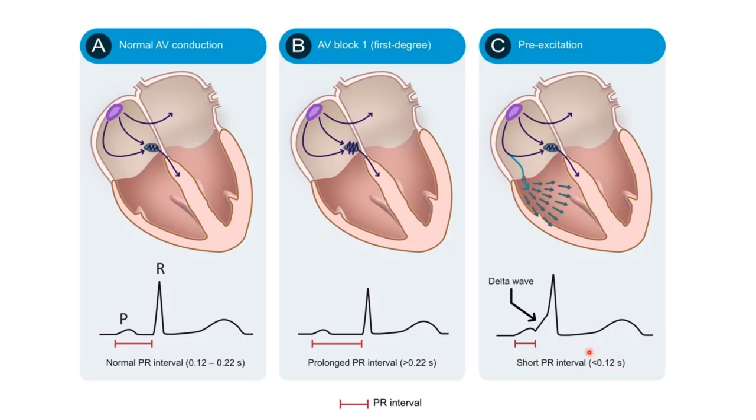So basically what happens in this is that in addition to your existing normal pathway, you have an accessory pathway that's bypassing the AV node. Because of that, some impulse manages to reach the rest of the fibers earlier, and because of that, you get this abnormal appearance with the QRS complex, and it's called a delta wave. But it's not very important. It's unlikely that this would show up on the test, but the AV blocks, they are important to note.